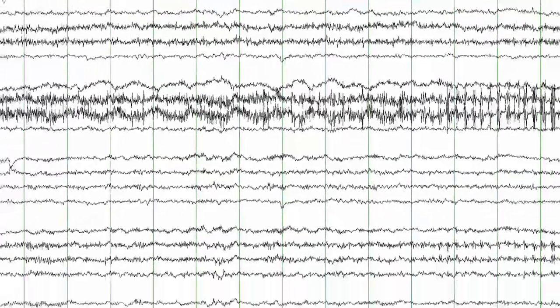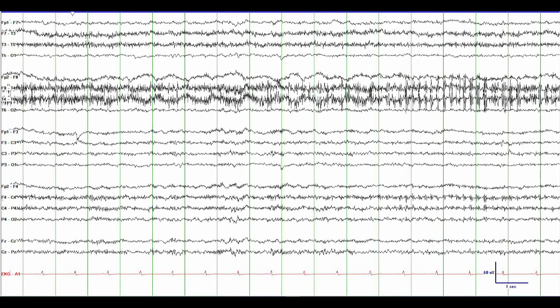In this case, we see lateralized rhythmic delta activity, LRDA, over the right temporal region. Superimposed upon the slowing within one of the most active electrodes, T4, is EMG artifact. To assist with identification of such slowing, reducing the high-frequency filter may be helpful.